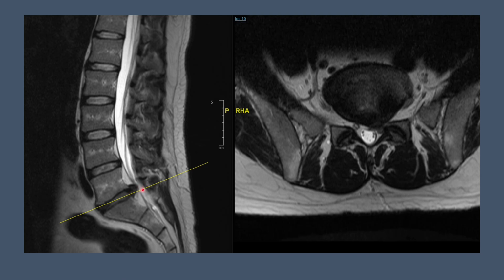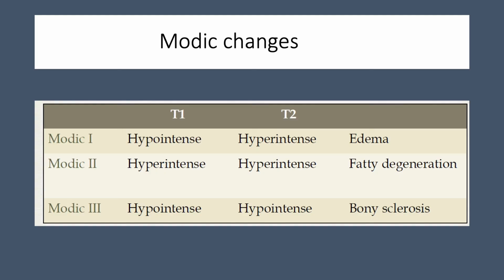So you can see that on your left side, between 5 and 1, there is a disc prolapse, which is touching on probably the traversing nerve root. And maybe your exiting is also partly compromised or impinged.